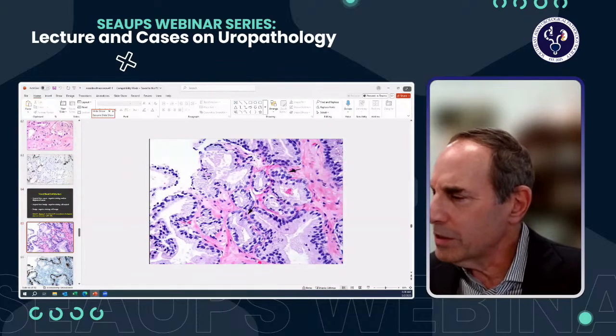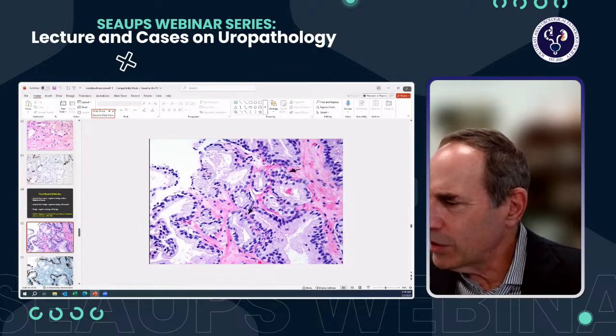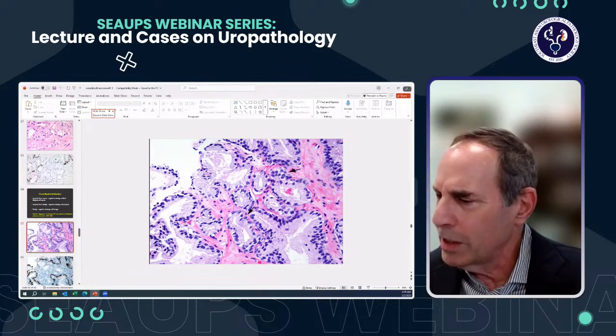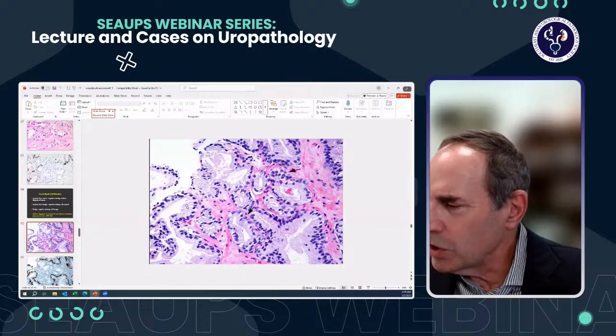So here's a case that I think is appropriate to use basal cell markers. So again, on a difficult case, we can see there's a crowded focus that catches our attention at low power. But what you want to do is first find the glands you know are benign.